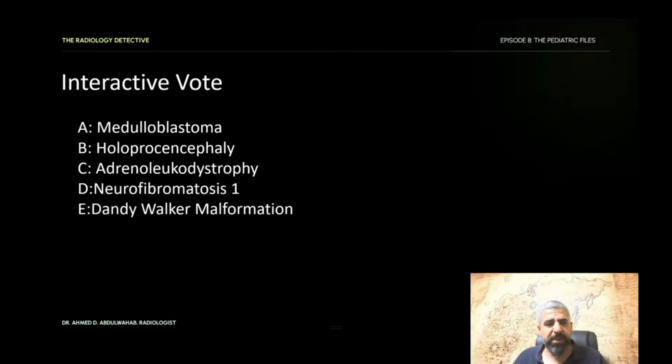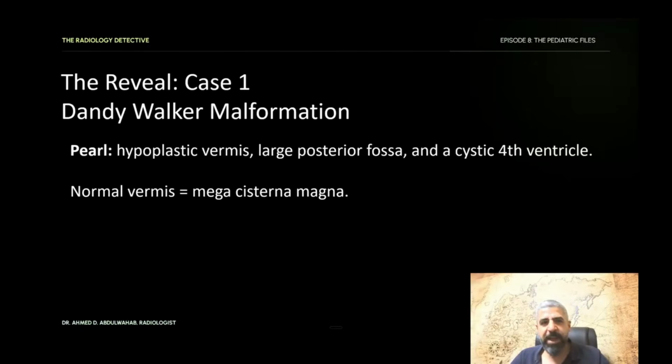What do you think this is? A. Medulloblastoma. B. Holoprosencephaly. C. Adrenoleukodystrophy. D. Neurofibromatosis type 1. And E. Dandy-Walker malformation. The case is E, or Dandy-Walker malformation.